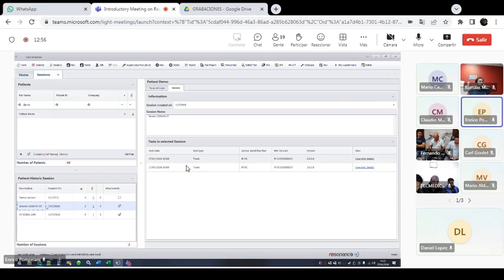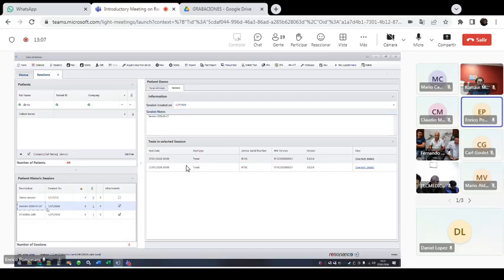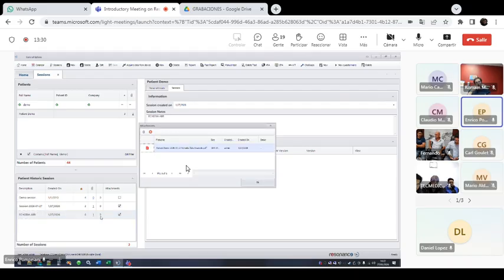resonance devices. If you don't have the session, you can manually create it as you have seen already in Romain's presentation. You can also do that even if you have already another session, just to provide a meaningful name for the session to represent the fact that it is holding the EcoDI examinations. For example, as you have seen before, this session is named EcoDI ABR, and it features an attachment that was fetched from the folder where the EcoSoft saved the PDF.